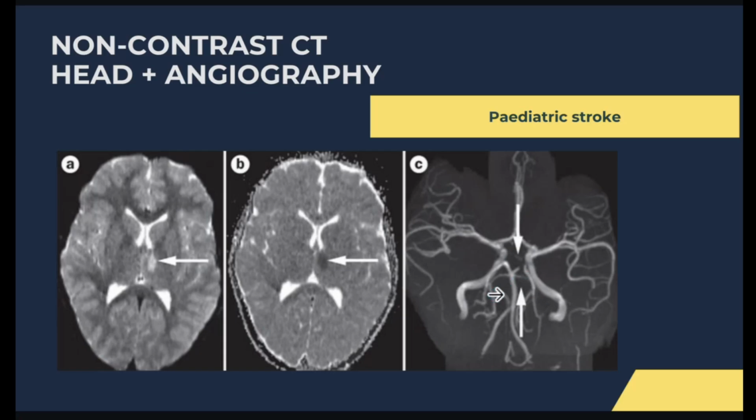And I think Dr. Ajalogba has something to say as well, please. Okay. It's a very subtle correction. The images that you're looking at are MRI images. The images we discussed initially were CT images, but these ones are so beautiful that we used this one.